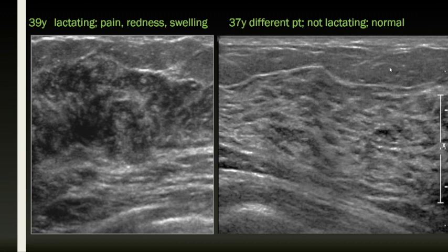The comparative tissue, the tissue relative to which your echogenicity is compared, is fat, which is less echogenic. So this is normal, and in this tissue you can see evenly the very fine ductal structures winding their way through. They are a fraction of a millimeter in diameter. You can see also the pectoral muscle deep to it, and everything looks orderly.